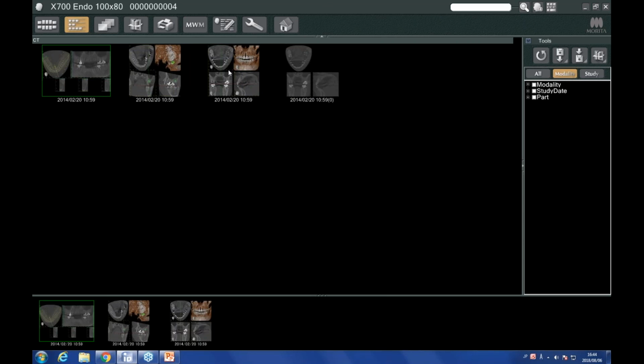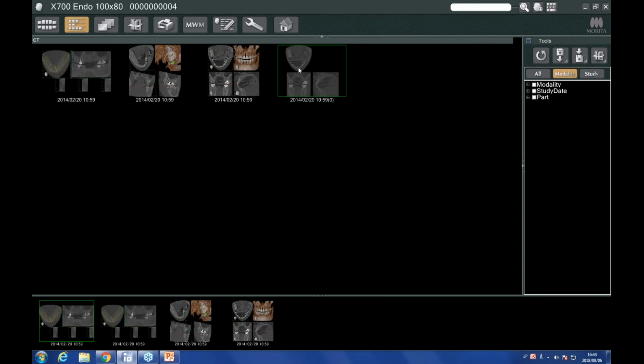data sets created. Now these are not copies of the original volume, which is over here. These are actually those saved states that we took. We saved the contrast adjustment first. We saved our implant placement, and we also saved this curved reconstruction, this panorama.